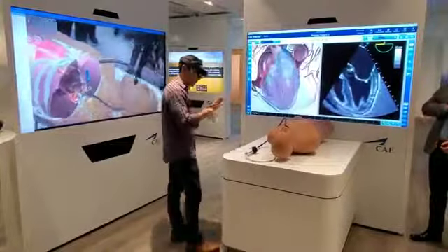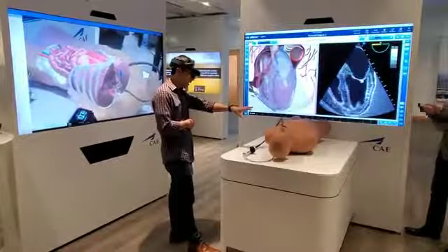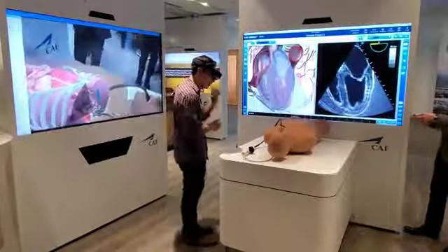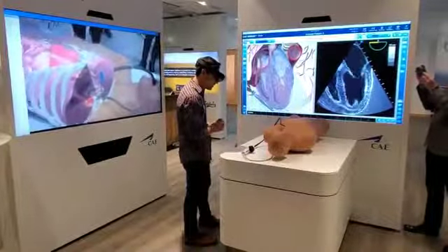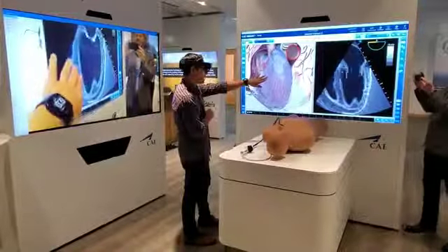Now that's a great step, but now that we've ripped that content off the screen and placed it here inside this mannequin, now let's enhance the visuals. Let's really accelerate the ability to understand. For instance, this 2D triangular slice, let's focus on that. Right now it's just this gray slice, and it forces me to look down and then look up to really kind of understand how it's visualizing it.